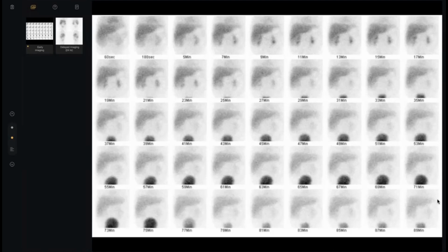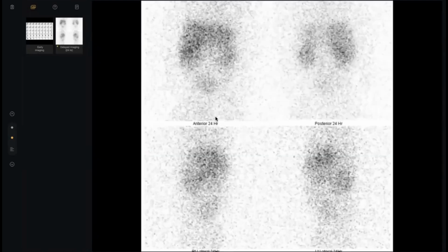At 69 minutes, so I would like to see a study at 24 hours. If there is no excretion at 24 hours, it will confirm the diagnosis of biliary atresia. I will convey the findings to the referring clinician and will advise MDT discussion, and it needs a surgical procedure, most likely a Kasai procedure. Thank you so much, doctor.